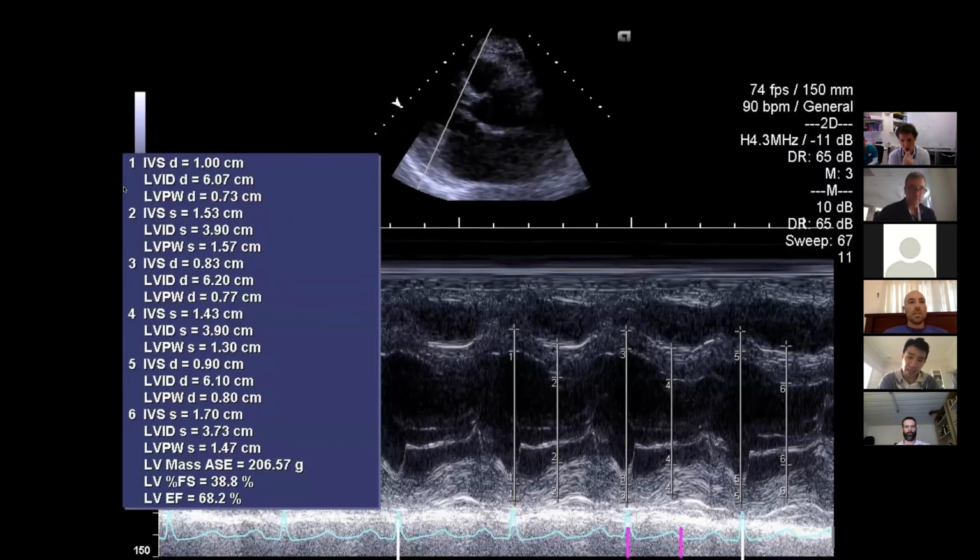So this is the M-mode through the leaflets, and the leaflets aren't coming quite together. Yeah, good call. Exactly. I think it's showing on the M-mode that there's maybe a bit of flail in there during systole. Good call. Excellent. So I think we're seeing that the posterior leaflet is sort of flopping down maybe during systole.